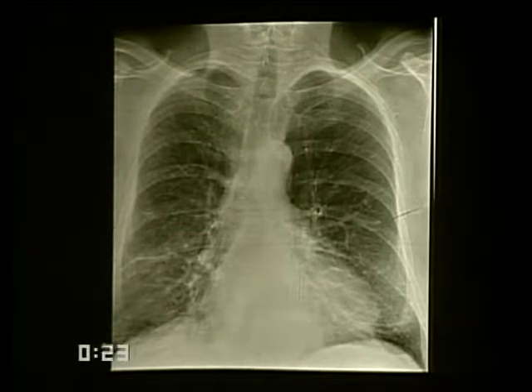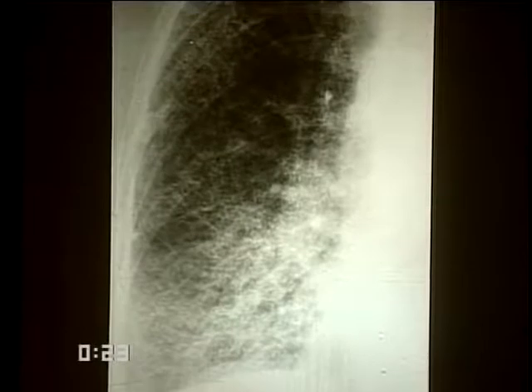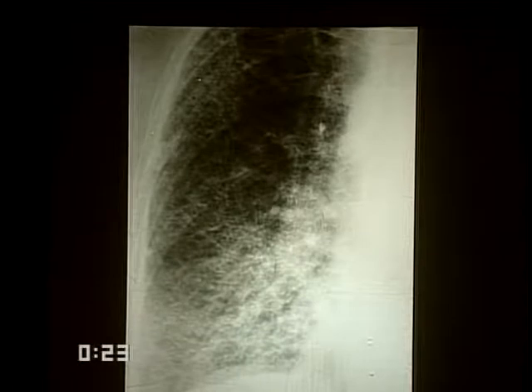There is interstitial disease in the bases due to repetitive aspiration, which will set up fibrosis. That must always be considered among the basal interstitial diseases, as well as the more classic things, like another example of usual interstitial pneumonitis that I've shown you, which is typically basal, reticular.